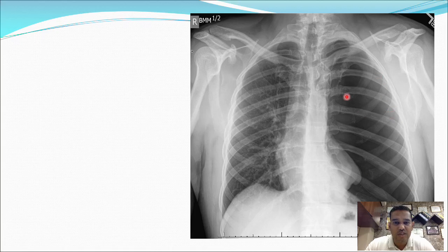No, I could not see. This is a homogeneously radiolucent area. You would not appreciate this. So this suggests there is air inside the left side of the chest, purely chest.